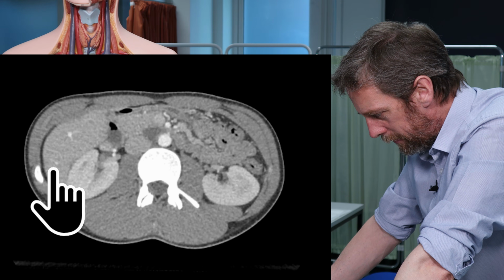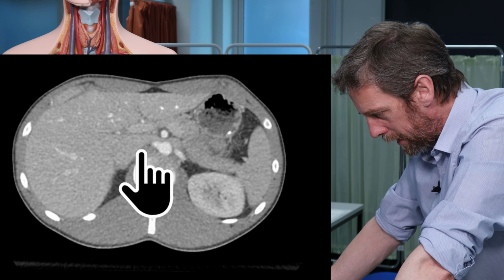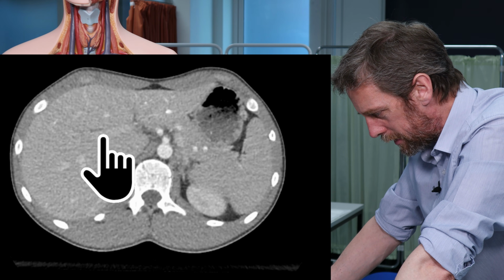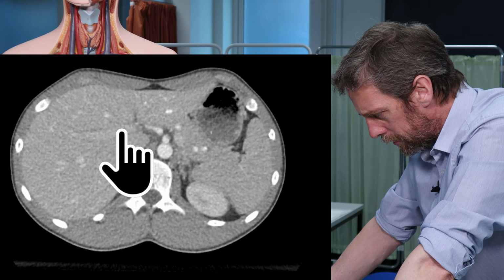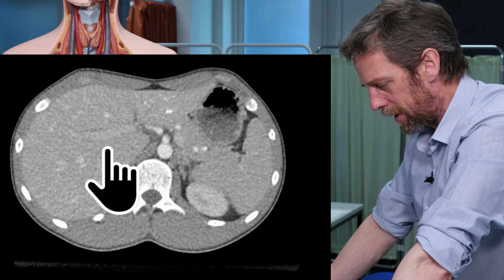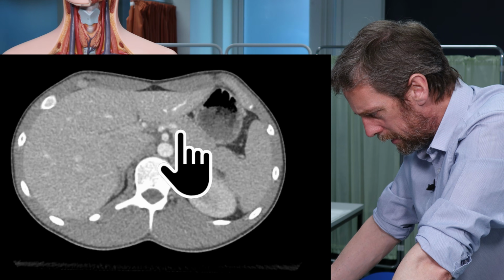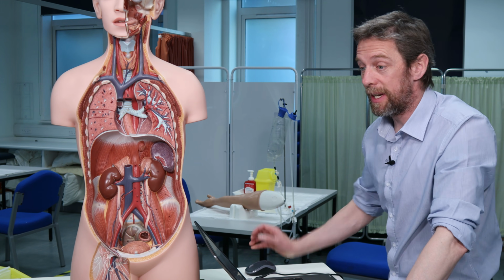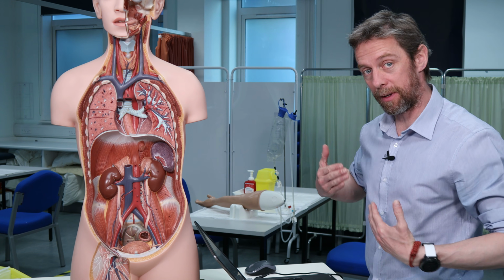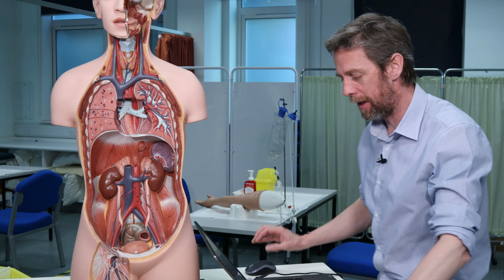So we're at the inferior part of the liver here, scrolling up, more liver, thick part of the liver, so the hilum of the liver is around here. We do have a lot of structures going to the liver actually, but this is quite a big blood vessel. Alright, so the hepatic portal vein carrying blood from the gastrointestinal tract into the liver. Tricky on these images. The portal vein is running within the free edge of the lesser omentum, so the stomach and the liver are attached to each other by the lesser omentum. The portal vein is running from there to there.